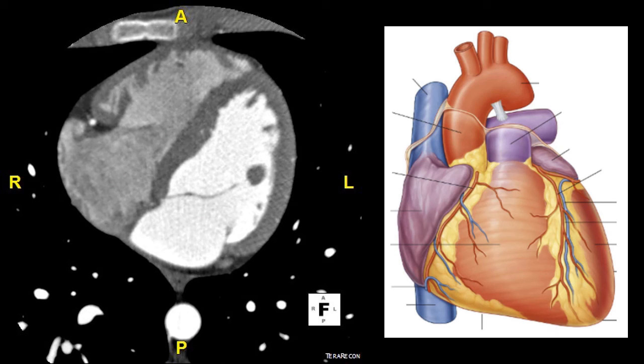Again, we scrolled through a lot of images until the chambers of the heart looked like they were at their largest, so I'm going to draw a line right through the middle of the heart, like so. From here, as we continue inferiorly, we will see the chambers of the heart become smaller and start to disappear. Therefore, there won't be any more structures to identify once we move past this image, so I'll finish scrolling through this image set relatively quickly.